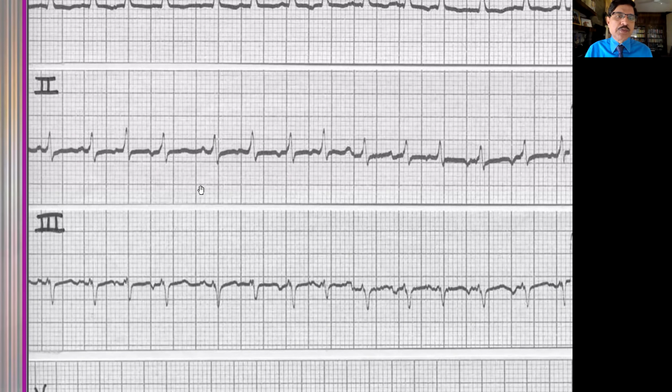Okay. So what did we do today? We have understood what is called EAT and MAT very thoroughly. The difference between them being EAT unifocal, MAT multifocal. Their P waves are of the same type, here P waves are of different types.